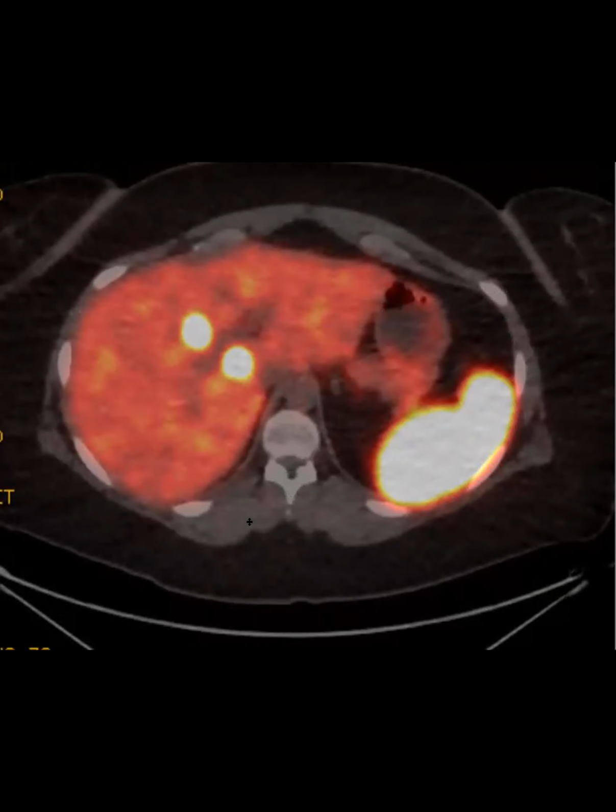Some of the smallest little enhancing foci you just never saw again on the arterial phase. Not even that the dotatate is positive in those sites necessarily, but maybe it's just more of the same. I think if they're too small and they don't have enough of that somatostatin 2 receptor, they won't light up. But you can see how beautifully they light up here. So dotatate's definitely the way to go. I just wanted to share that because I wanted all the trainees to see that sometimes these lesions just really aren't that well seen on your regular sequences, like the T2.